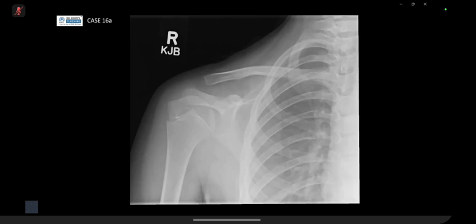You can only see the right acromioclavicular joint, where there is widening. Okay, so what if I tell you that you can feel a palpable lump or pain at the medial clavicle on the right? I might see an expansion at the medial aspect of the clavicle, however, no cortical disruption or periosteal reaction.